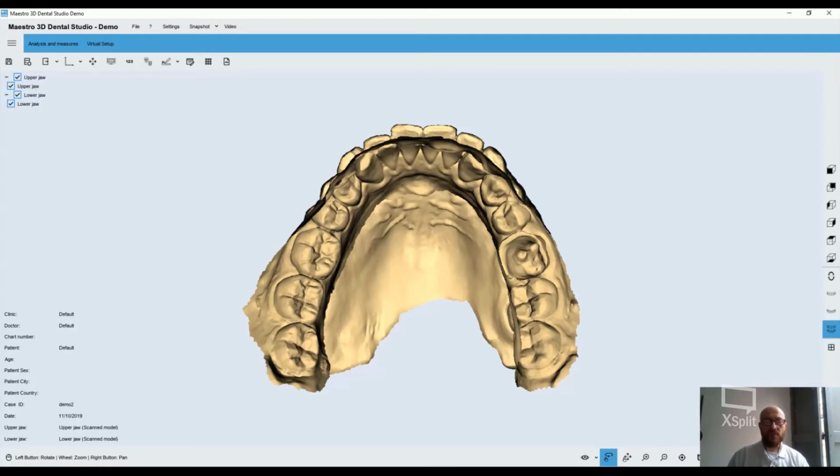So we can start. The first step is related to the reference coordinate system. As I told you before, the system is open, so you can import data from every kind of scanner. So it's necessary to put the objects in the correct system of reference that the software requires. For doing that, we have a tool called Change Local Origo.